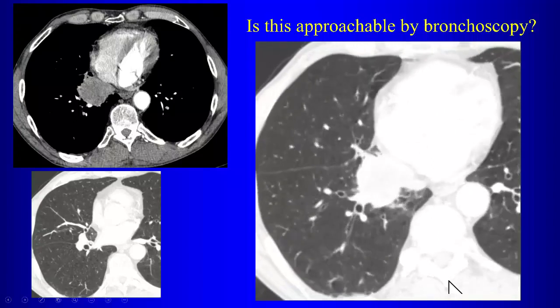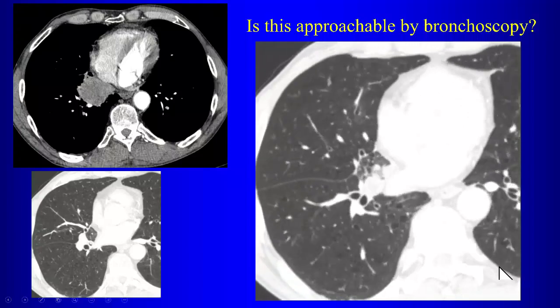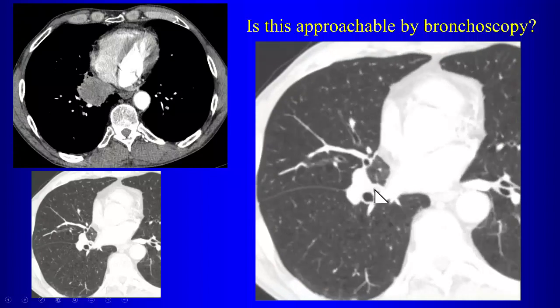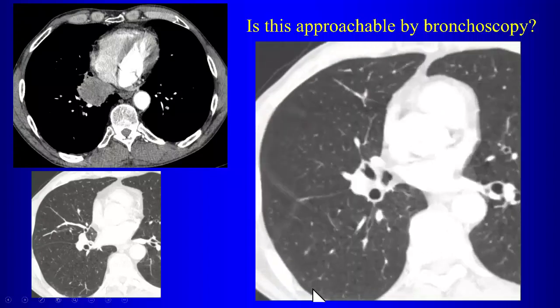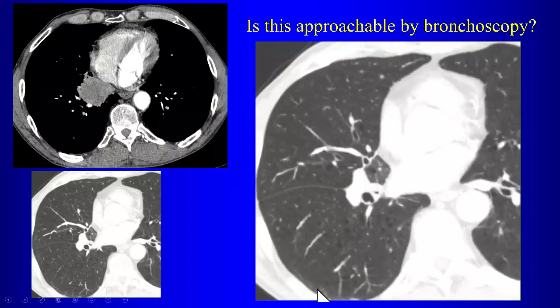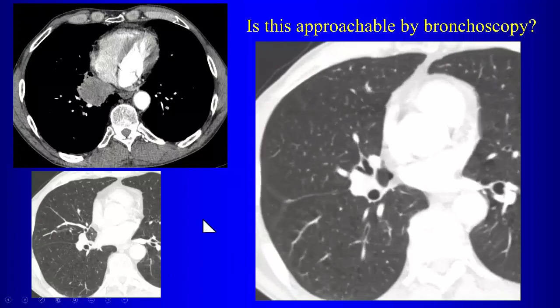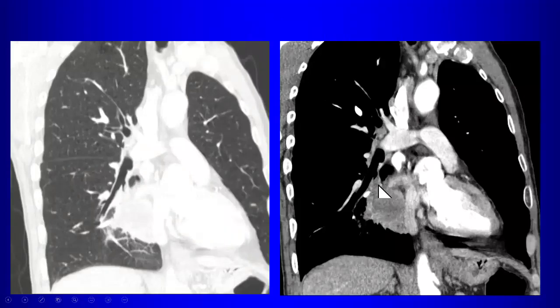And the order of that division is medial, anterior, lateral, posterior. So this one, you can see the obstruction here as we come down is in the medial. There's the anterior, lateral, posterior. So you would tell a bronchoscopist, go to the medial basal segmental bronchus, and that's where you'll find the tumor. Right? That's where it is. Okay? So there it is there.